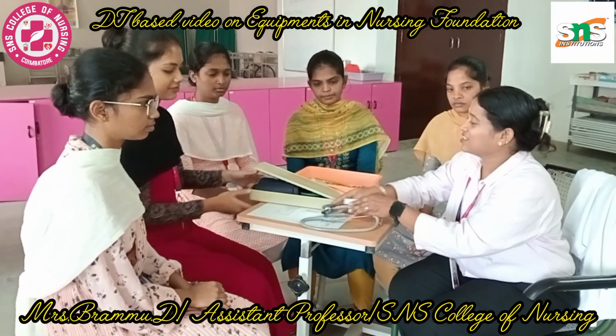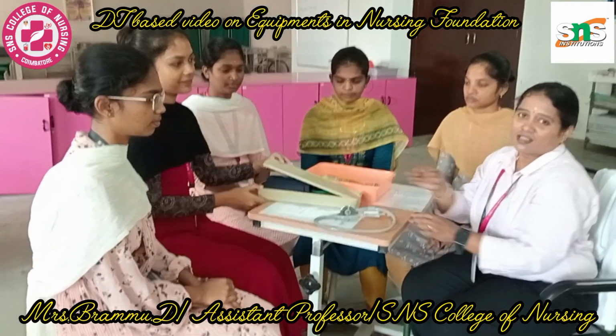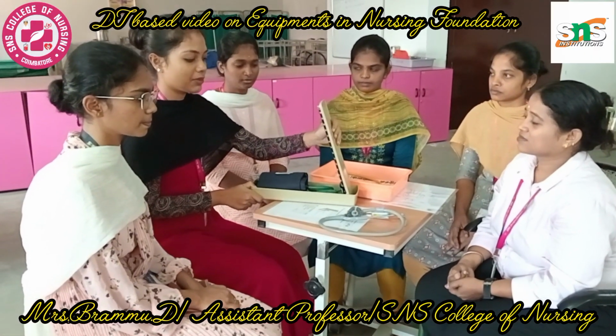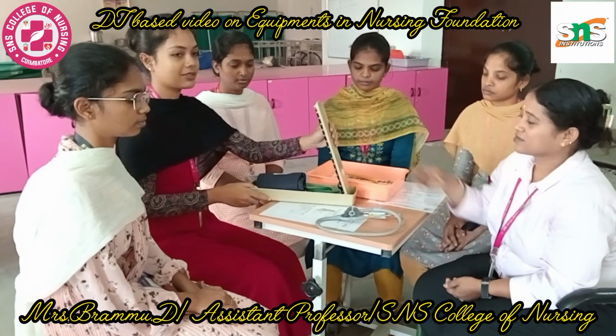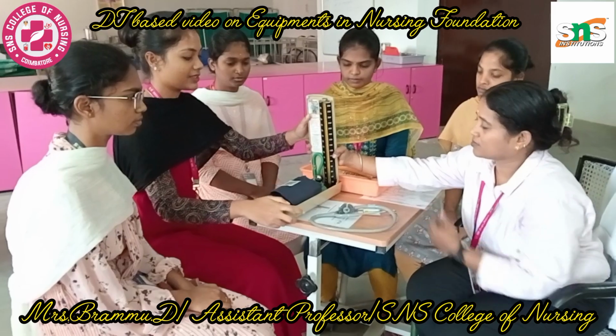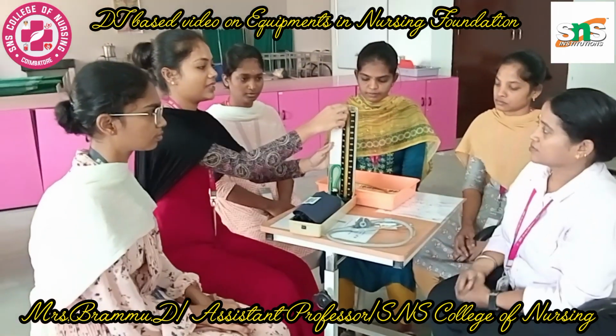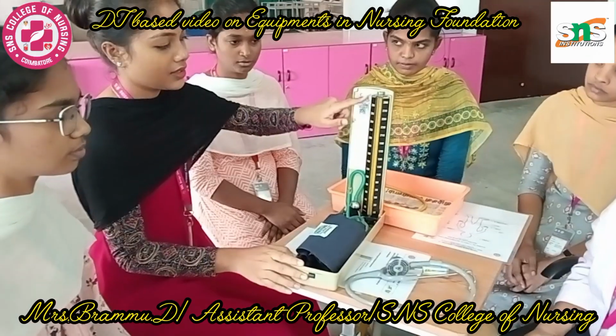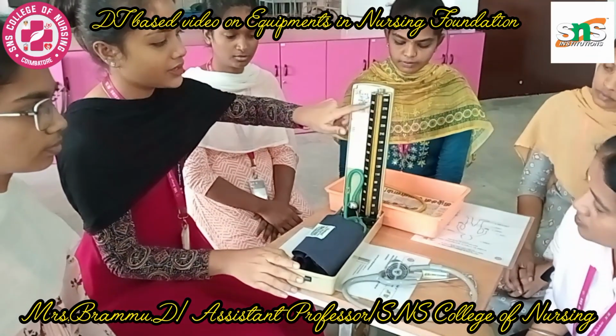Over to Ms. Christina to explain the parts of the sphygmomanometer. Good morning all. Now I am going to discuss the parts of the sphygmomanometer, which is also known as the BP apparatus. On top we can see a screw, known as the screw cap, and following that the scale with numbers.